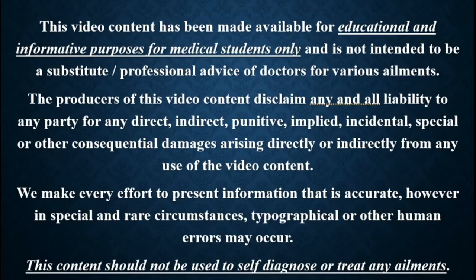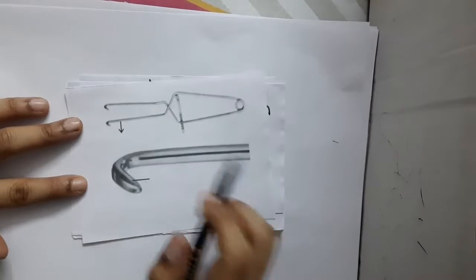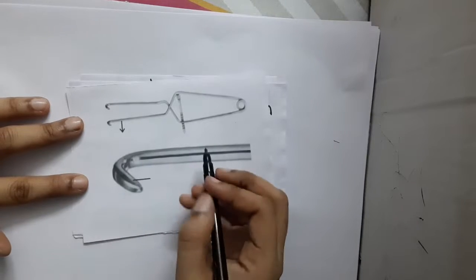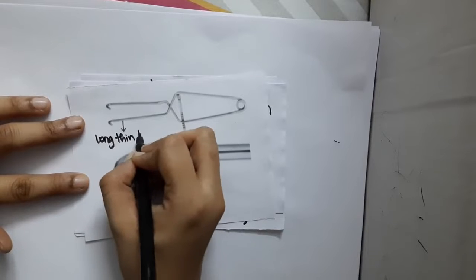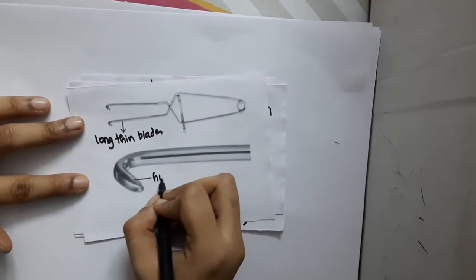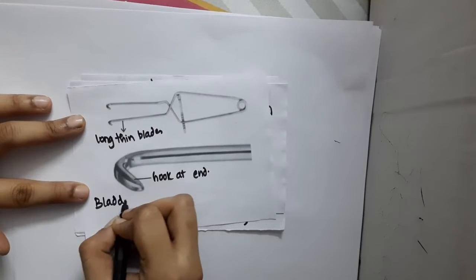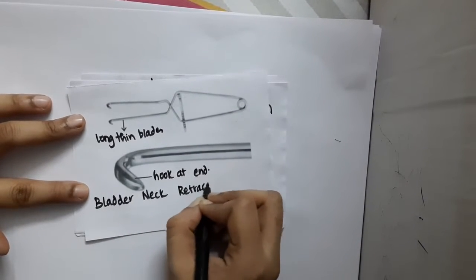In this lecture, we will learn about... Hello friends, identify the instrument. This is the instrument. This end, if you magnify, you will get this. So, if you see, these blades are actually long, thin blades. And if you see at the end, this end, you will see the presence of a hook at the end. So, what is this? This is actually a bladder neck retractor. It is bladder neck retractor.